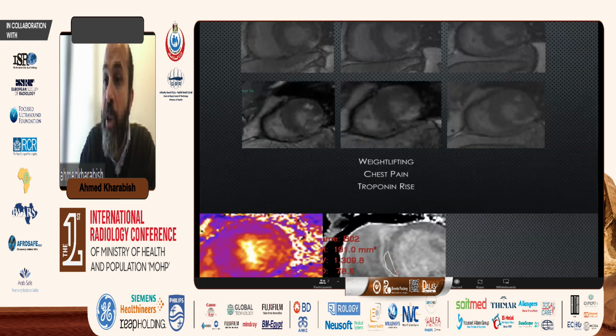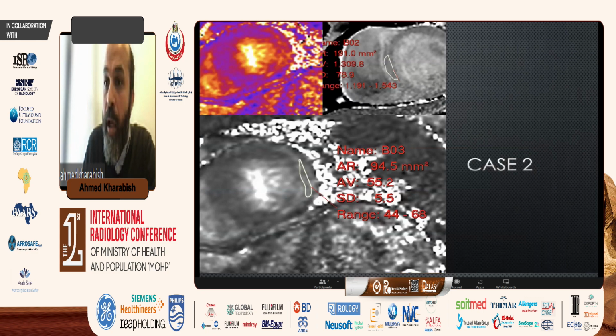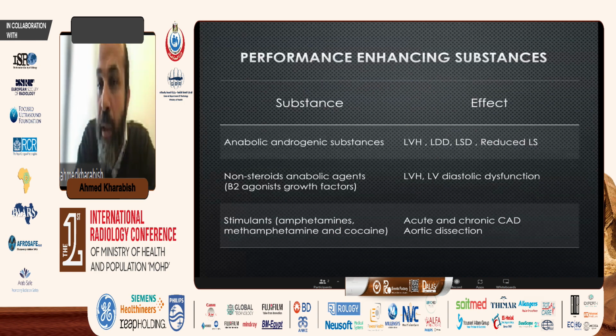Kindly be always mindful that T1 mapping was also not abnormal, showing 1300, so no interstitial changes. For edema, this parametric mapping was on the 3 Tesla, so 55 on T2 mapping is a kind of elevated. So be mindful that sometimes some athletes are using performance-enhancing substances.